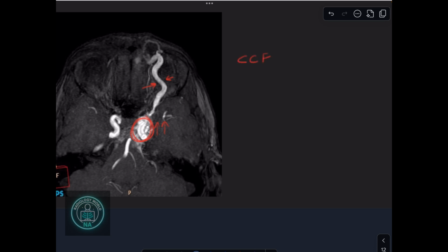Either it is idiopathic, or it can be traumatic. If it is traumatic, they will usually give you a history of an accident, or it can also be seen with some connective tissue disorders like Marfan disease or Ehlers-Danlos syndrome. Here you can see that there is a fistula formed between the internal carotid and the cavernous sinus, and because of this, the cavernous sinuses are very bulky, and even the tributaries are not able to drain, so the superior ophthalmic vein will be very bulky and enlarged.